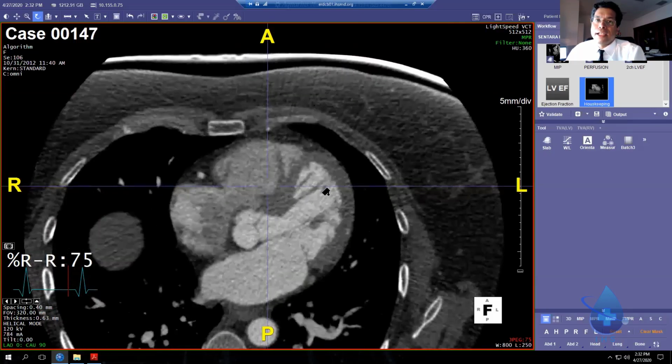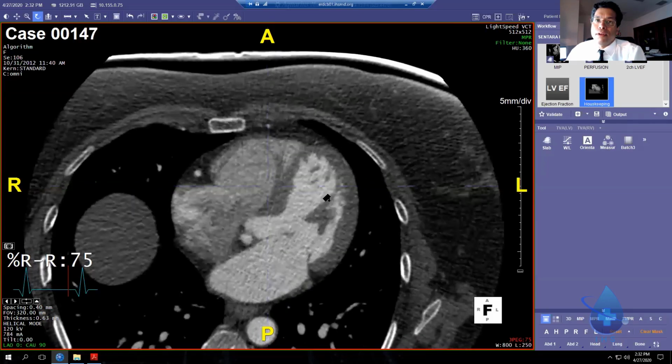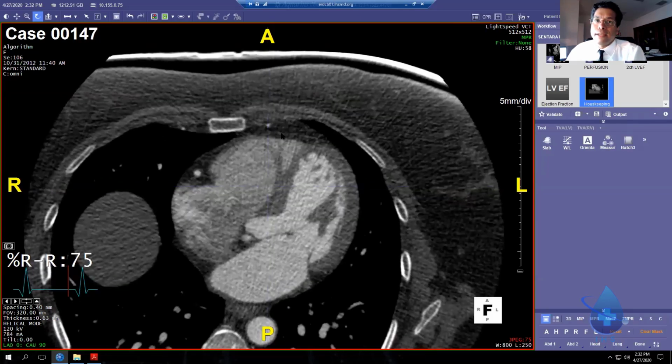And it doesn't get any more normal than that thin little white line right there. Okay, that's normal. Tomorrow, I'll show you what constriction looks like because I work in Norfolk, Virginia, where there's a ton of asbestosis from the shipyards for the last 30 years. And so I've had a crash course in constriction for my career here.